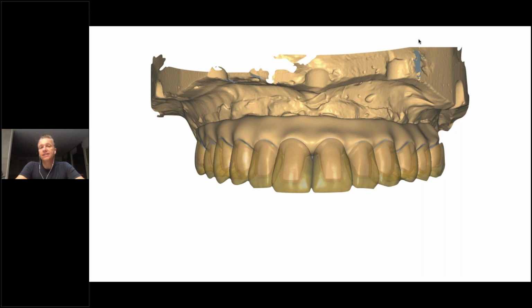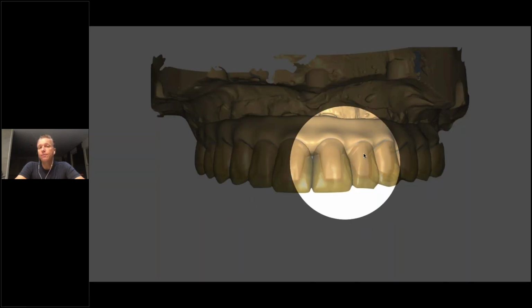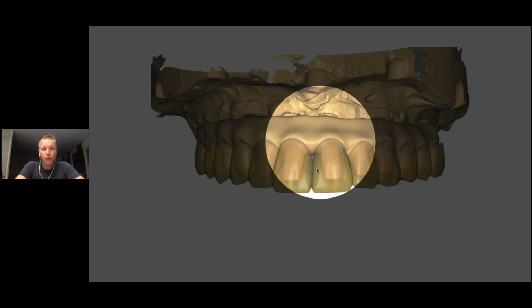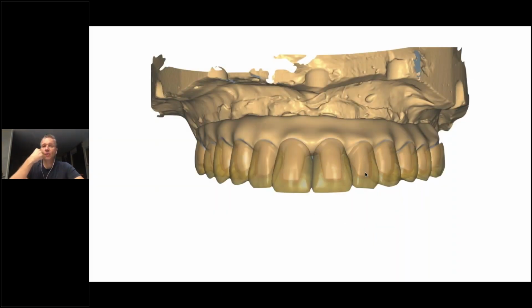So we designed basically the gingiva part. Here I used the thimble module. Basically, I designed thimbles, and then straight on the thimbles also the crowns. With the new update we have with Ceramill Mind now, we can do all in one shot. We don't have to rescan or fabricate first the thimbles and then the crowns. Now, I usually go from A to Z in one shot. That also allows me to keep much more control over the restoration.